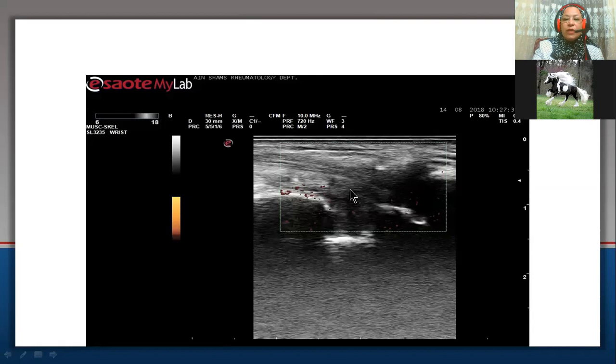There may even be a tendon tear, a partial tear. At the same time, there was a bizarre-shaped or abnormal irregularity at the second and third metacarpal bones, which indicates either the presence of a fracture or a bone abnormality in general.